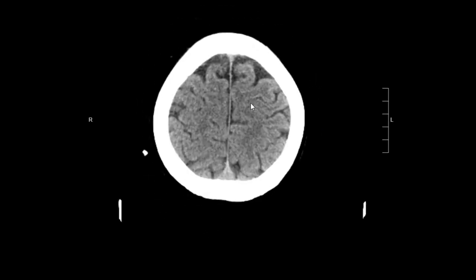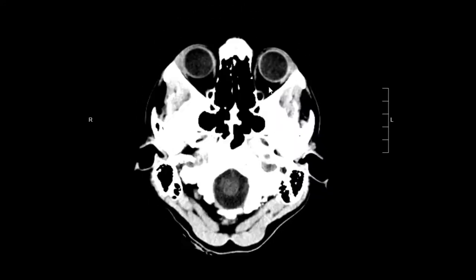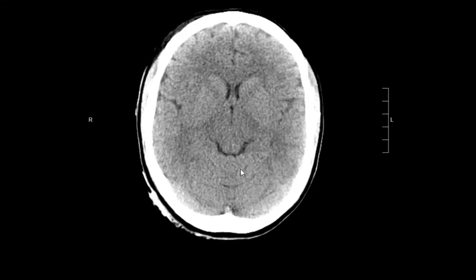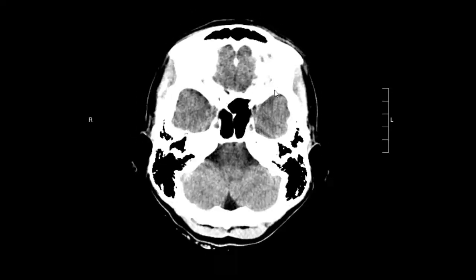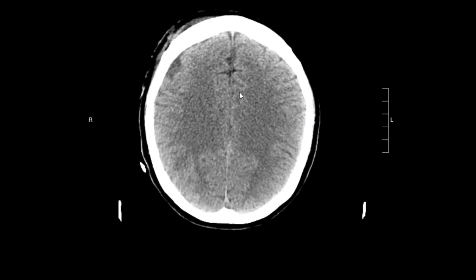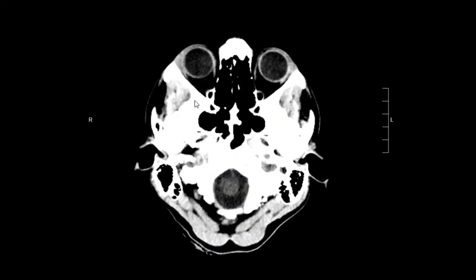I'm going to look along the left side of the brain, and I also don't see anything. We'll look in the infratentorial compartment where the cerebellum is, and I don't see anything there. Now, I've already looked for blood, but I've also evaluated for any obvious mass or any kind of midline shift or abnormal mass effect, and there isn't anything here.